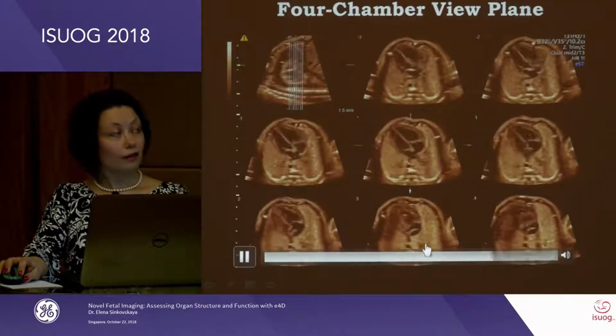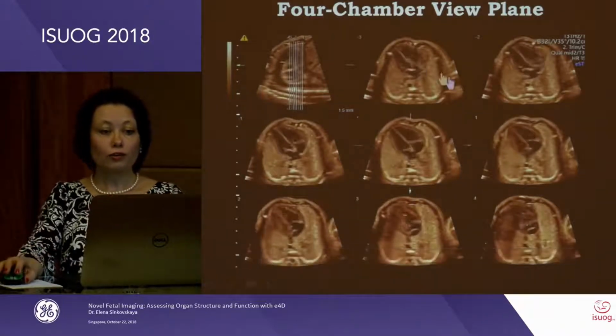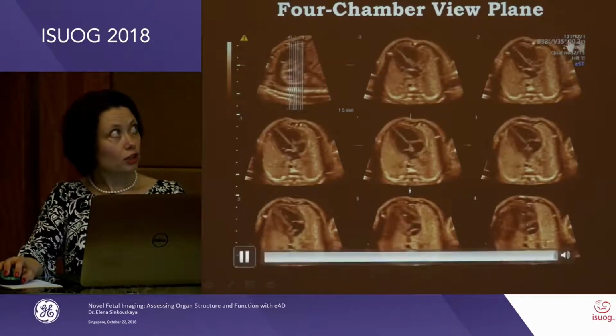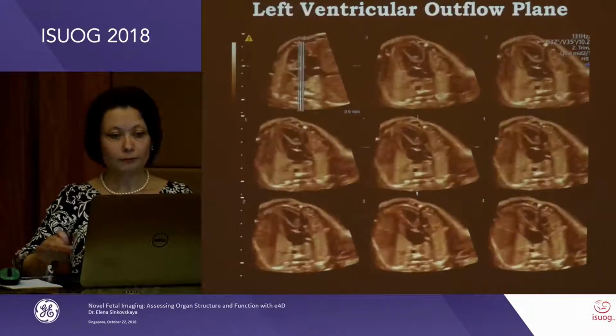Also, we can see the views below and above that allows us also to account for the differences that we can see between 17 and 24 weeks gestation, for which gestational age this software was developed.